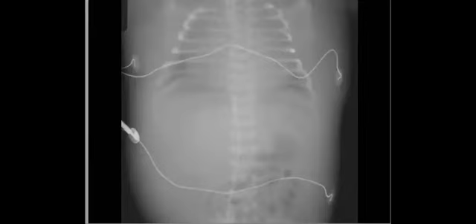So you suspect that maybe something in the abdomen with this tumefaction appearance, white abdomen. So you think that maybe mass, ascites, bowel. Yeah, you will think about many differentials, right? Maybe bowel displacement. But you suspect that maybe something in the right upper quadrant and there is some displacement.